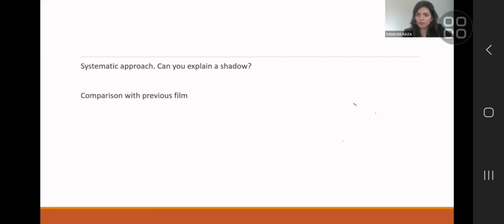If that previous is more than a year ago, that's even better. So your best friend when reporting a chest X-ray is the previous film. The minute you approach it with that view, you will realize what a huge variation of normal appearances there is in the human body. Just like a human body can look a million different ways in a normal person, an X-ray is just a representation of the same patient.